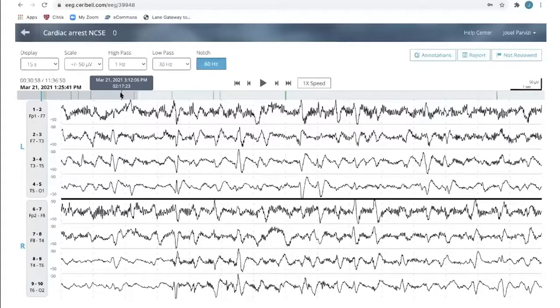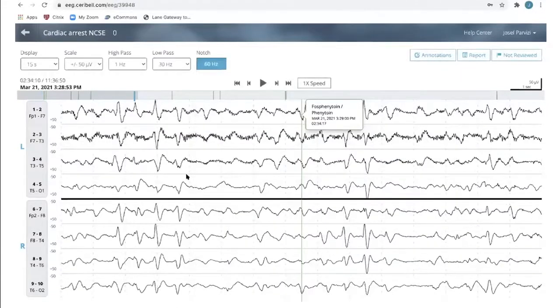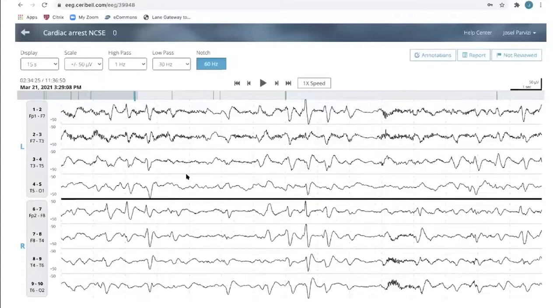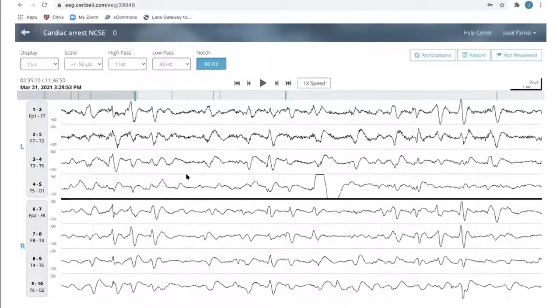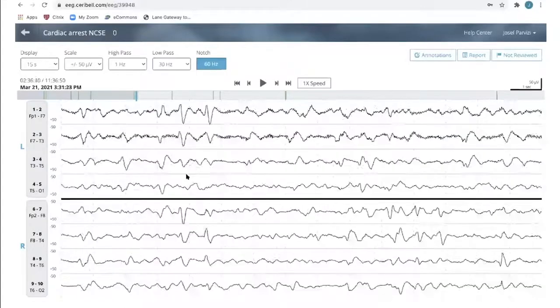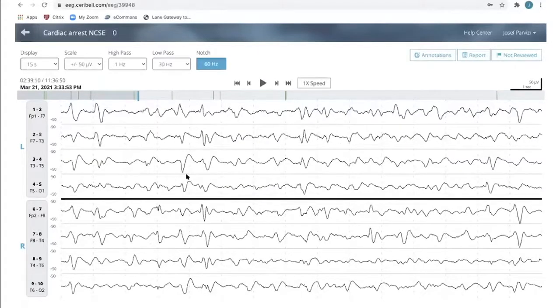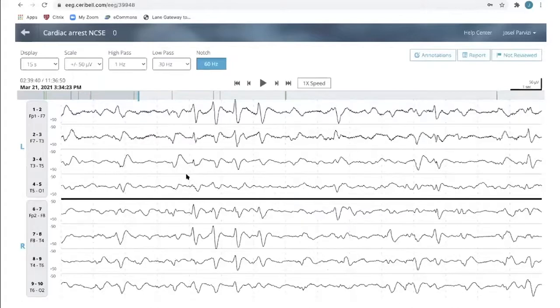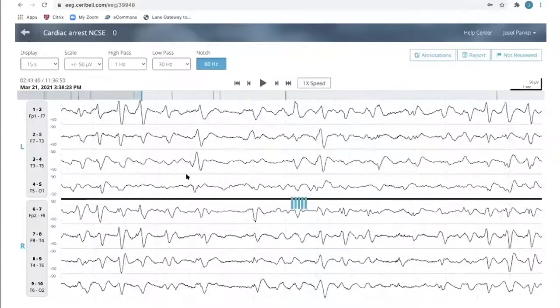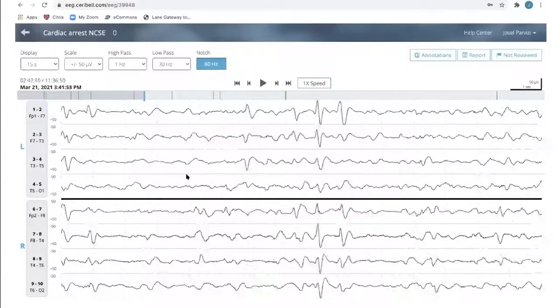Right. So if we go to the first fosphenytoin dose, that's really where you see the background change. There we go. Here, this is where it's starting to infuse. We still see a lot of these abnormal sharp waves with after-going slow waves across both hemispheres, occurring at up to 2 to 3 hertz, and then it'll dissipate for a few seconds and come back. And then as we go, after he was hypotensive, this was very difficult to get him onto a significant dose of fosphenytoin safely, also with VFib arrest, with arrhythmia. But as we go on, all of a sudden, all these discharges nearly dissipate.